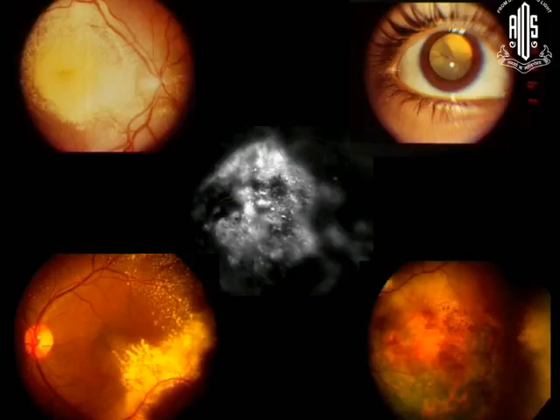So in my opinion and experience, what I have found is Coats to be the one where you cannot differentiate from retinoblastoma most often, and that's where the wrong diagnosis comes in. So these are all pictures of Coats disease. You can see this one we can simulate a macular retinoblastoma, but if you see the lesion is breaking up in bits in the periphery, that would be an exudate suggestive of Coats disease. And again, this we already saw, a total exudative retinal detachment with all the subretinal exudates underneath mimicking a mass lesion. But these are the classic cases.